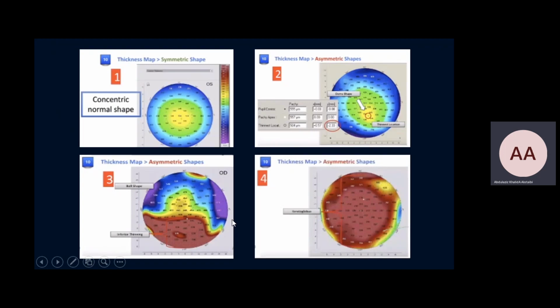I will remember to rule out dry eye, contact lens warpage, all of these things, corneal scar, before you comment on it. What do you think of this last map?